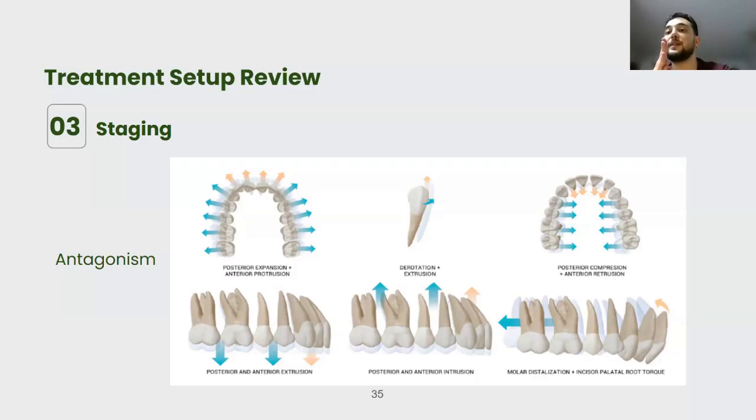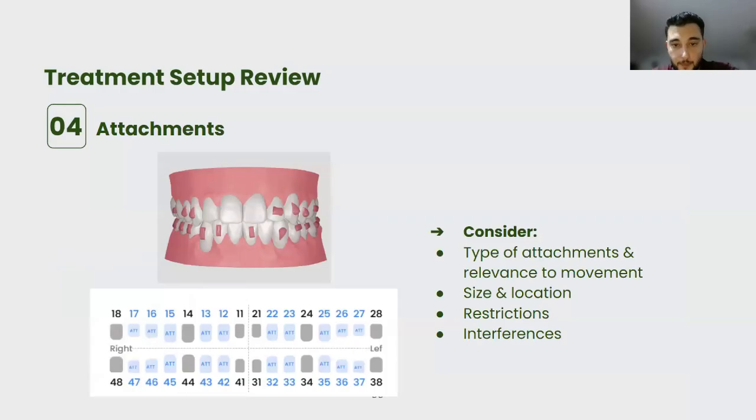And once it reaches the final position and the other tooth goes halfway to the final position, I can move the next tooth, and we go on until we move all the teeth. This is why distalization cases are usually high in the number of aligners and the treatment duration, because we have to separate the movements according to what I just explained.